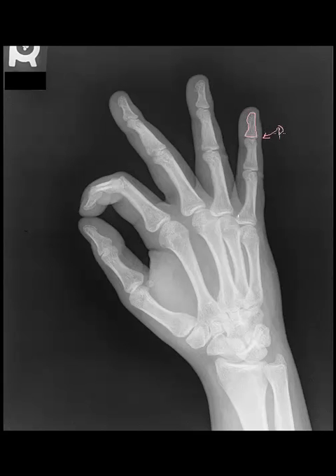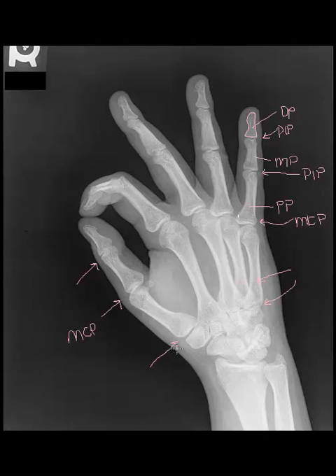Here's the distal interphalangeal joint, which makes this the distal phalanx, middle phalanx, proximal interphalangeal joint, proximal phalanx, metacarpal phalangeal joint, carpal metacarpal articulation, of course the metacarpals, interphalangeal joint of the thumb, metacarpal phalangeal joint of the thumb, and again carpal metacarpal joint. Again, carpals, scaphoid, lunate, triquetrum, and pisiform. Distal row, trapezium, trapezoid, capitate, hamate. And the hamate has this nice little hook here. Ulnar styloid, radial styloid, radiocarpal joint.